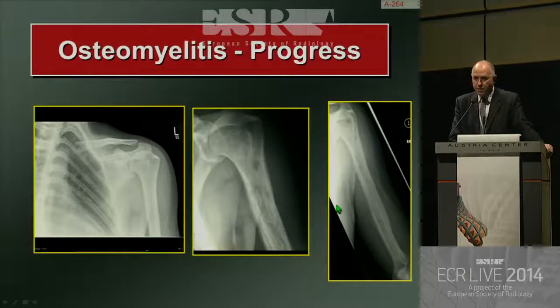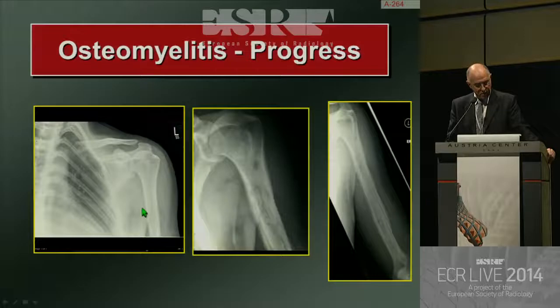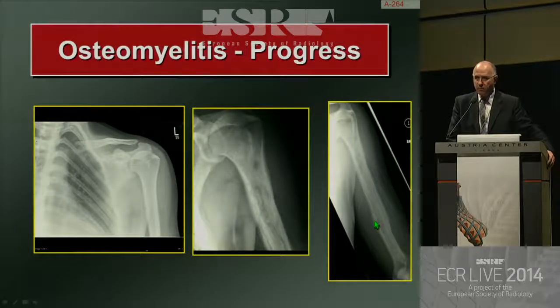I'm going to take you through this very recent case that we've had to highlight the progress between the acute phase, where you can't see anything on the plain film and the patient presented, to the subacute, and then the chronic osteomyelitic phase. You'll notice on this film there is a bone within a bone appearance, and there are two well-defined lucencies, one here and one there. To have clear lucencies, the defect must involve the cortex, so they are more likely to be cloacae.